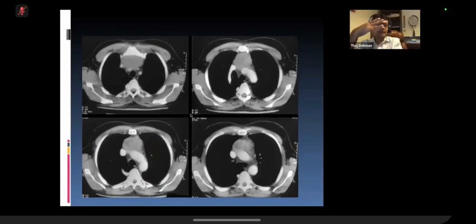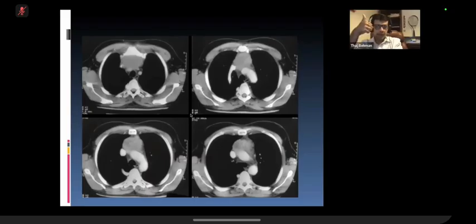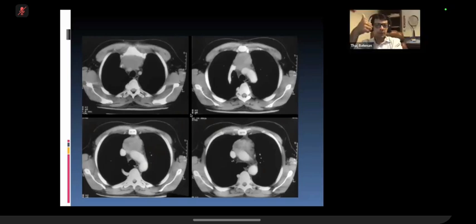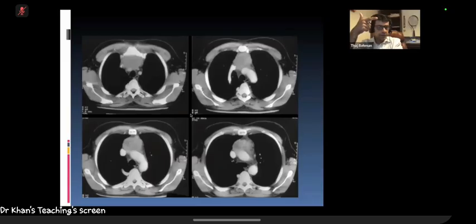So there were only 3 things that you have to keep in mind. We said, it can be a thyroid goiter, which is a thyroid. So check if it's more superiorly. Yeah, it can be a bit more superior. It can also be nodes, lymph nodes. Or thymic tumor. Those are the only 3 things that you have to keep in mind in this region.